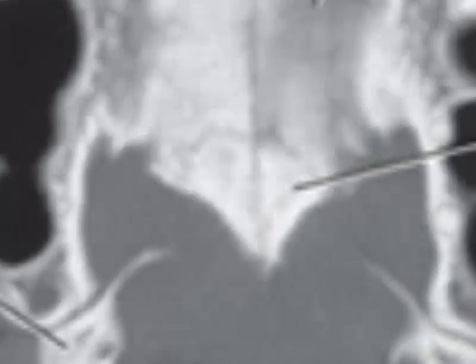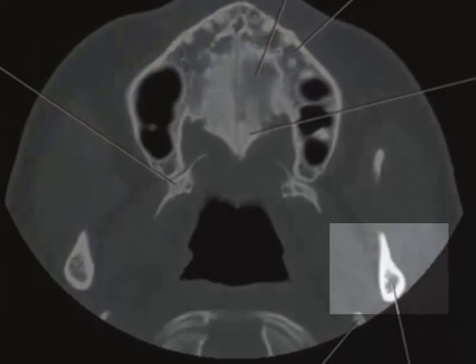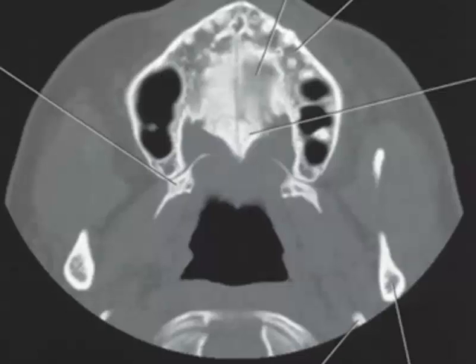A small portion of the mandible, the condyle, is visible towards the posterior part of this image. Cranial structures visible are the pterygoid processes of the sphenoid bone, articulating with the maxilla, and the styloid process of the temporal bone, deep to the mandibular condyles. In the center bottom of the image is a portion of the occipital bone that's not labeled.